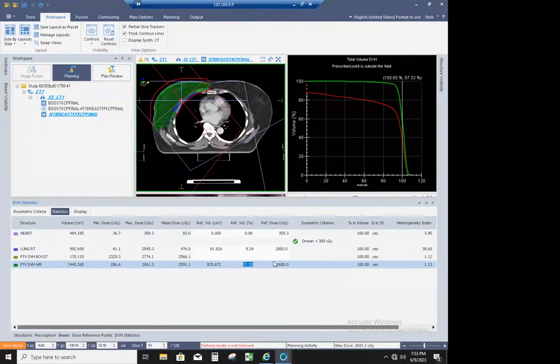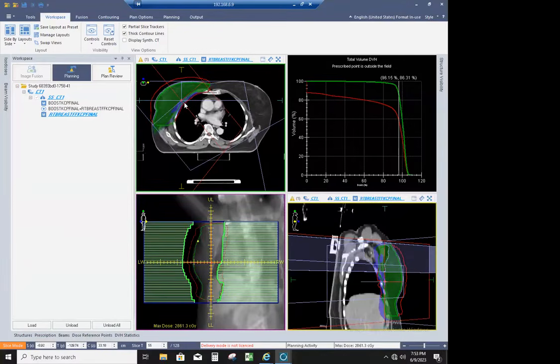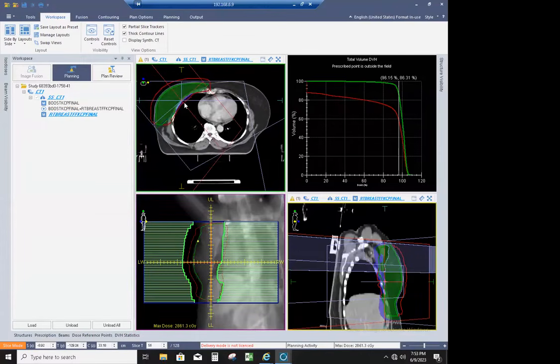Oh, sorry. So we have strictly followed the guideline of the DVH protocol. You can see that is 90% coverage. You can go through these articles and fast forward protocols and you will have a good idea.